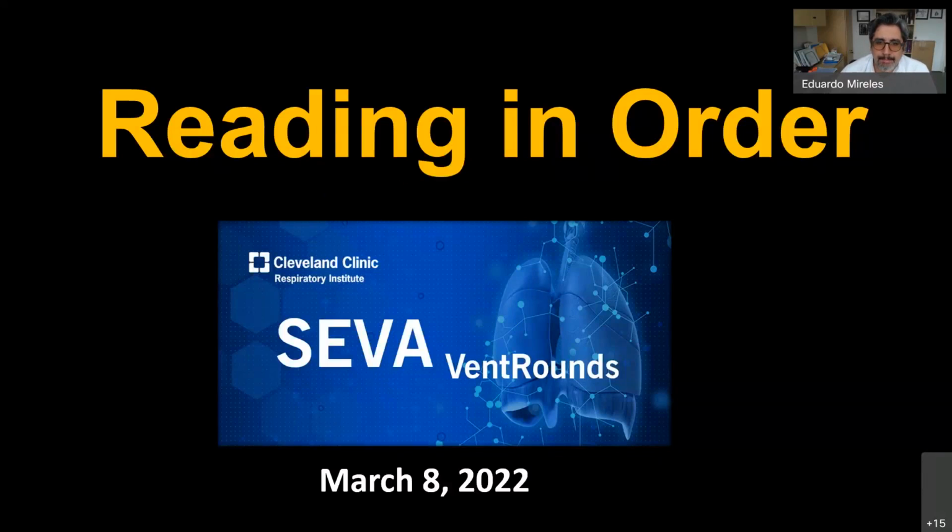Today's March 8th, 2022, and the title of today's reading is in order. There are several examples that we're going to go over, and I think they are good examples of why going in order is effective when going over the waveforms.